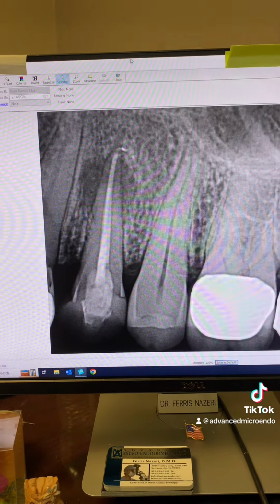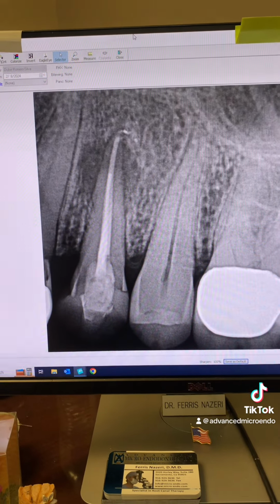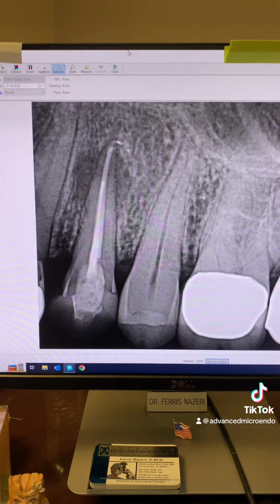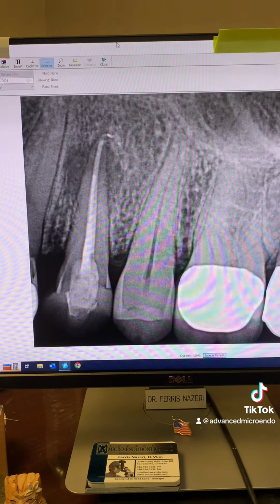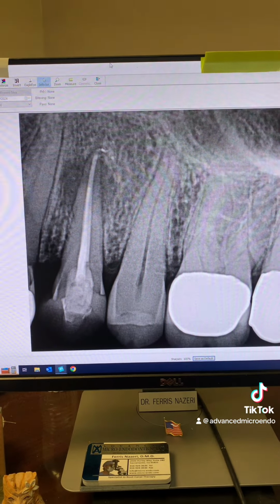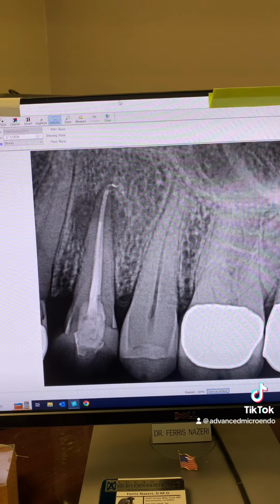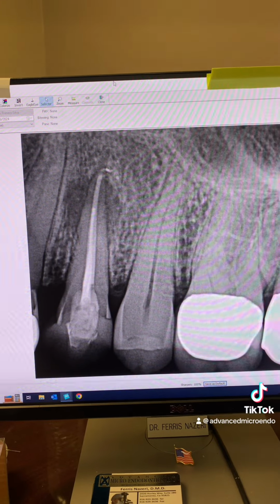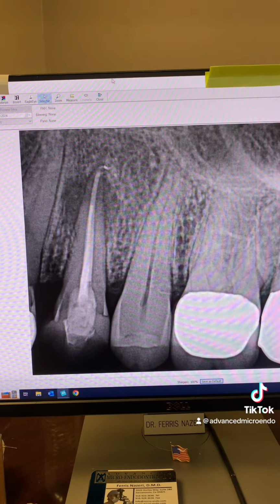All right. So if I just rely on one angulation PA and want to make a diagnosis, my diagnosis will be wrong, and the patient will suffer, not only financially, but also emotionally and physically. And of course, the treatment or retreatment in this case won't work. Take a look here. So tooth was percussion and palpation very tender. Mobility was slight, but still within normal limits.